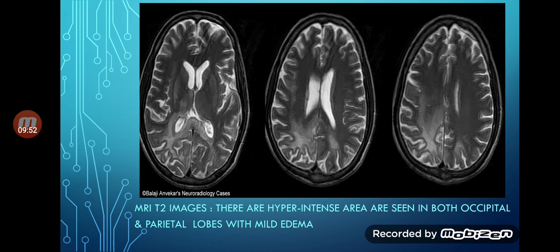Okay, now how can we differentiate this imaging from edema associated with a brain tumor, or edema associated with a brain abscess? Or how can we differentiate this from infarction? How can we differentiate this image? The answer to these questions is as follows.